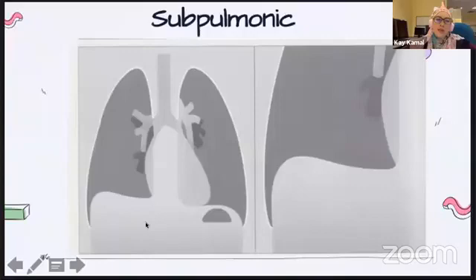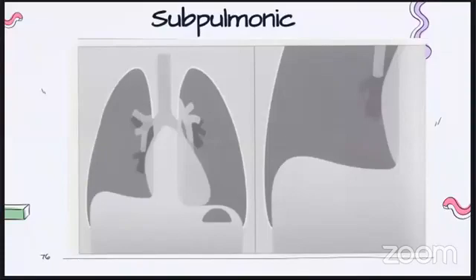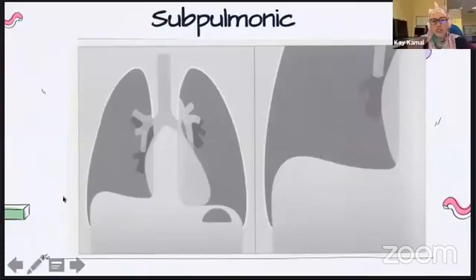And we can also have the subpulmonary type. The subpulmonary type is actually the pooling of fluid in the pleural space below the lung. So there's two, the right side and the left side, and each of them gives a different appearance. So if you see the diaphragm on the right side, suddenly its highest point is too lateral, you must keep in mind that there must be some form of subpulmonary effusion. Because usually your dome of diaphragm is quite central, but in this one the peak is too lateral, so you must keep in mind that there might be a subpulmonary effusion on the right.